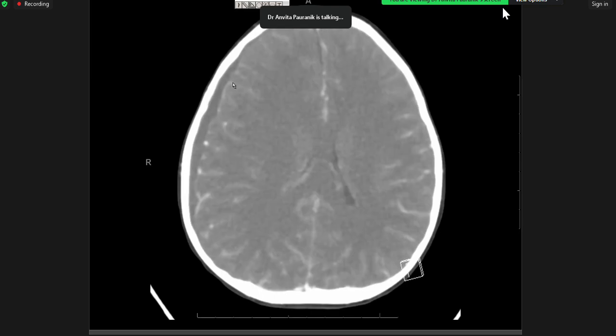And again, the collection not enhancing is not relevant, because you can have a clinically proven patient with meningitis, for example, and their brain scan can be normal. Meningitis is more of a clinical diagnosis with LP, right? And our role on imaging is to look for complications. So if you see enhancement or you don't see enhancement, that single thing alone doesn't dictate.